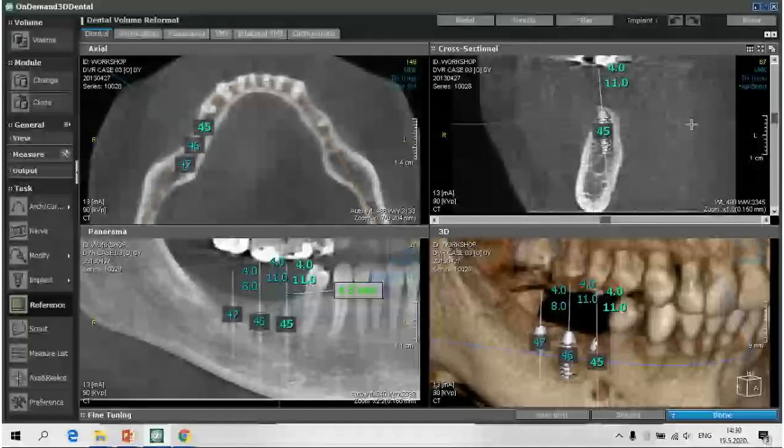They do their job more than well in 98% of cases, but sometimes they call me and say, please, could you look at this volume before we present it to the practitioner, to see if we did that well. And mostly the situation is a difficult recognition, or a double mental nerve opening, or a double canal.